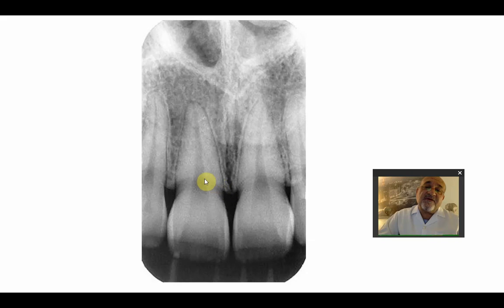While this line over here actually represents the tooth socket, which is composed of compact bone. You can see the socket. It starts from here. See this line, which we call the lamina dura, goes up and surrounds the whole root, and just next to it, on the inner part, there is a radiolucent line which represents the PDL. Now the socket of the tooth ends here at the alveolar crest.